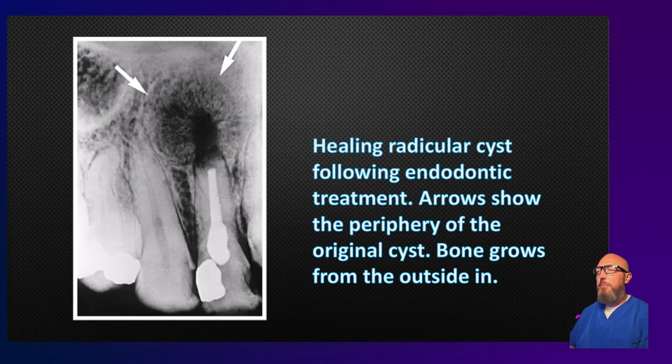There's several times I've been given an image like this and people don't know what's going on. They think it's some radiating lesion. And this sometimes happens if you had a previous periapical cyst and it was enucleated, sometimes just an inflammatory lesion, a granuloma, and then you do the root canal or sometimes extraction and it starts to heal. The healing takes place from the outside in, and that bone looks a little bit amorphous. It kind of has this radiating pattern. I call this the Eye of Sauron pattern because it looks so much to me like the Eye of Sauron.